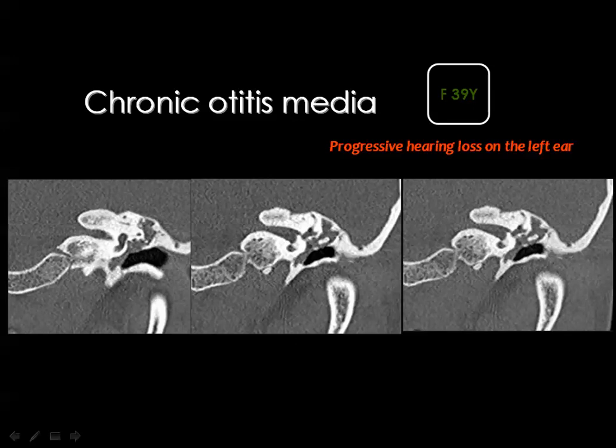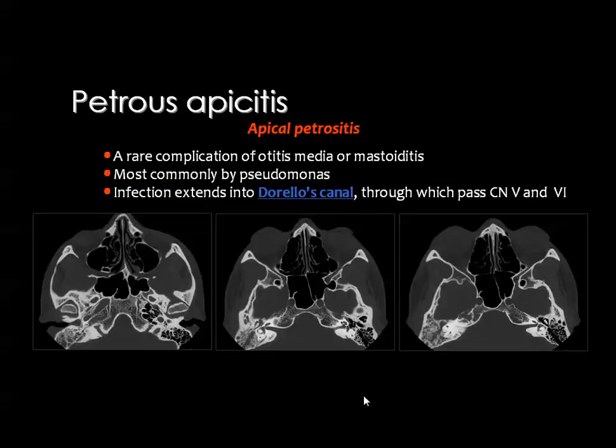Also, if the middle ear cavity is totally opaque, such as in this case, and you cannot judge the dependency of the fluid, then you need very much the help of the clinical data, because the clinician is able to differentiate between otitis media and cholesteatoma just by looking through the otoscope.